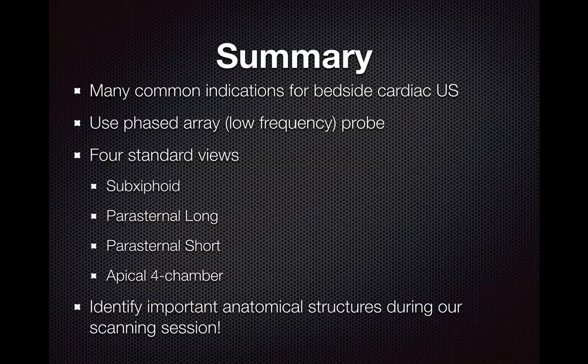So in summary, there are several common indications for bedside cardiac ultrasound that we went over. We'd like to use the phased array probe, which is a low frequency probe to give us good depth of penetration. Also, you're going to use the cardiac mode for the ultrasound, although you can use the abdomen mode if you'd like to see the anatomy a little bit better when we start. We went over the 4 standard views: subxiphoid, parasternal long, parasternal short, and apical 4-chamber. And we identified some important anatomical structures that we will look for again during our scanning session.